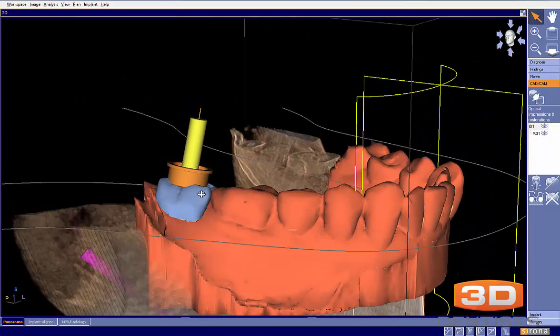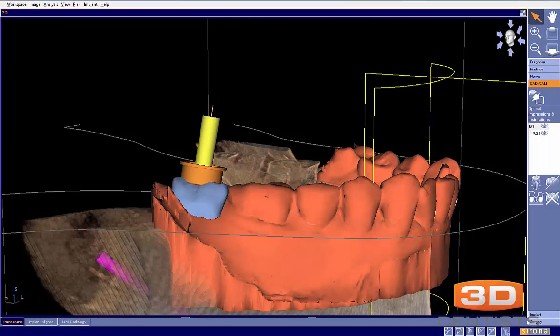My one critique of this particular case would be the buccal margin contours. So if we were to draw a line for our gingival margins just like so, like here, we would see that the margin for our virtual tooth is much lower than our adjacent teeth. Okay, so we know that there's a high likelihood that this margin is incorrect. So in all reality, this margin should have been drawn probably right there.